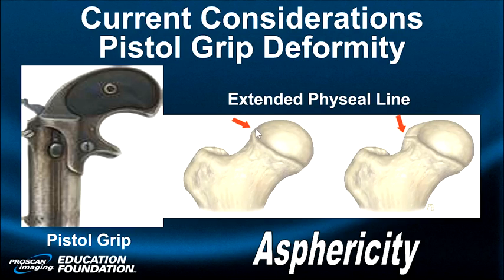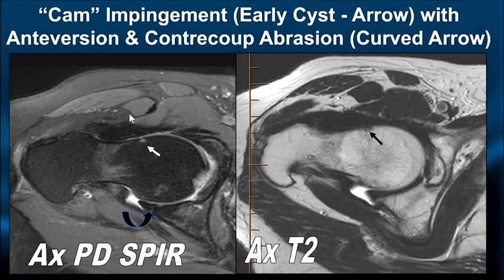So here is another example of cam impingement, but in a different projection. It's in the coronal projection. Once again, a bump cyst complex, but you could acquire that, right? With a spur, just like we did yesterday, the one I missed. So a tiny spur right there will have the same effect as a dysplastic bump cyst complex. Now, this configuration is known as the pistol grip deformity.